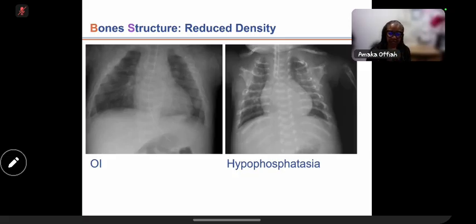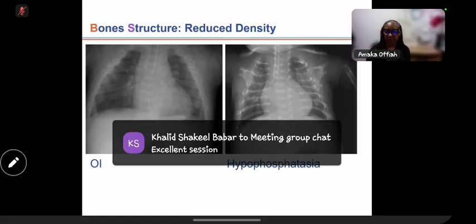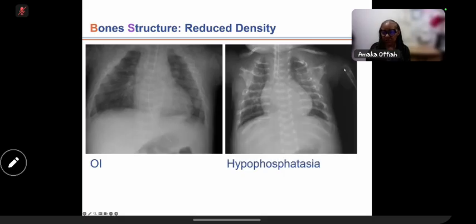I've put hypophosphatasia next to OI because any time you're thinking of osteogenesis imperfecta, automatically ask yourself, can this be hypophosphatasia? The reason is with Strensiq, with asfotase alfa, we can treat and we can save lives. Yes, it's expensive, but these children can now survive with enzyme replacement therapy. The features to look for are the abnormal ossification, and in particular, the strands of metaphyseal radiolucency that you might pick up on the chest radiograph at the proximal humerus.